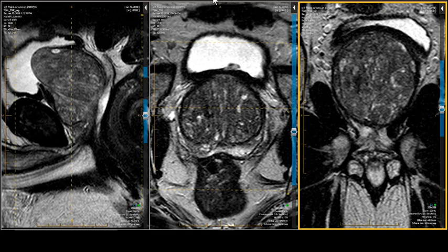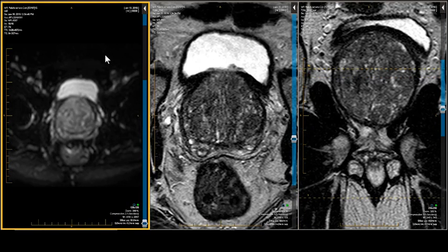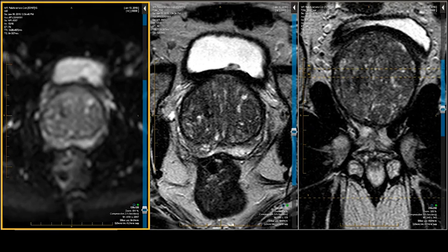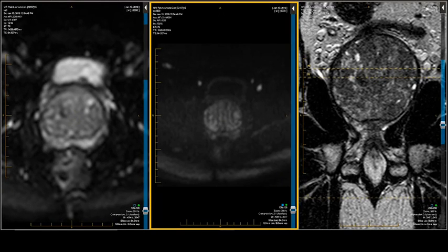Now, when you look at the diffusion-weighted images in BPH, you should not see anything that progressively gets brighter. So here's a low B value, B0. Let's blow it up for you. And then let's take something really high. This is a 1500 B value. Let's blow that up.